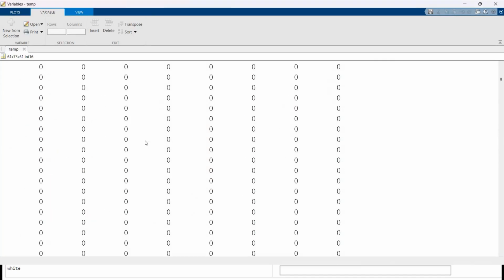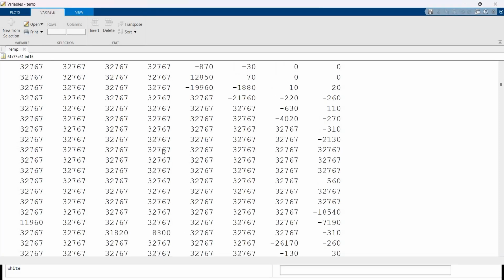If you look at the middle, they are just saturated and they only have the number 32767, because those were very big numbers that all got rounded off to 32767, and that's what corresponds to white in grayscale. That's why the information is gone and I can just see the same number everywhere, which corresponds to white, and so everything became white.